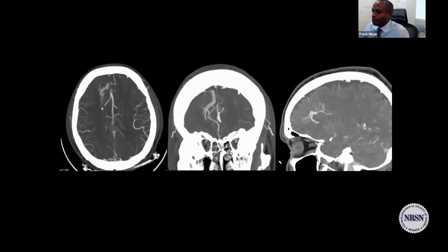Remember, a DVA is a branching abnormality. Normal veins, abnormal branching pattern. So stellate appearance. Go look up caput medusae. You have a tree with a branch and then many, many little branches. That is not what an AVM looks like. So do not get fooled just because you have this dilated big vessel.